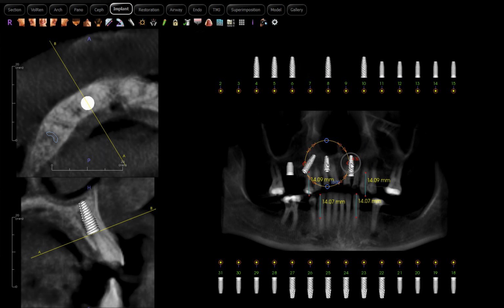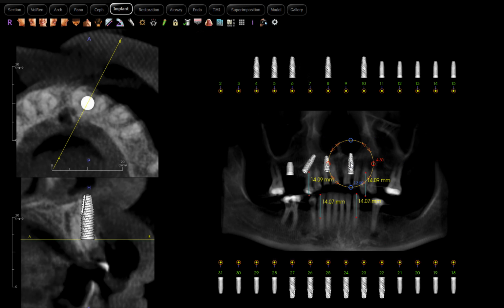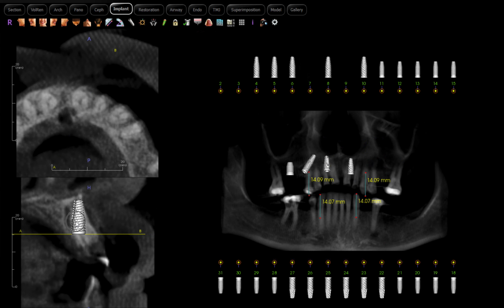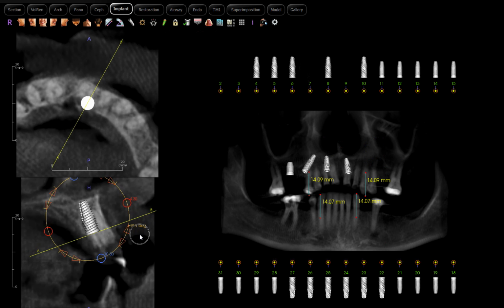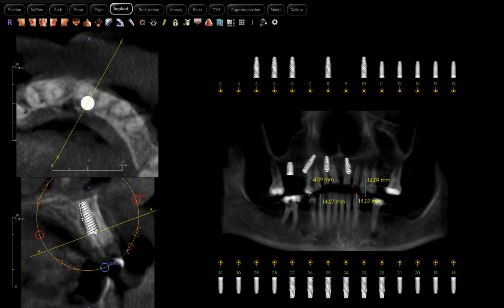We'll add another one here between the other central and lateral. And similar situation, we're going to shorten that to a 10 millimeter. We'll put that in position. Now as far as our positioning here, on the coronal end we're positioning kind of at the palatal third. So we're not clear out here on the buccal because that's where we sometimes will see resorption.